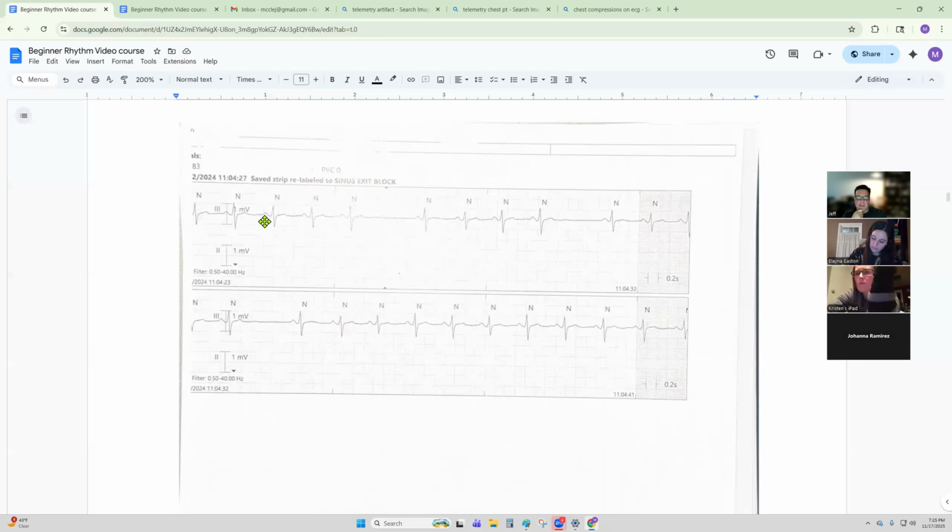So what's happening is, if I had calipers I could use on the screen, you would see if I took 3 P waves, this would march out. And what that means is the SA node is contracting regularly at 83 beats per minute, and a P wave should be there. The SA node knows it contracted at that moment. Beyond that, its job's done. It could care less what happens. It's still going to beat again exactly on time. So with sinus exit blocks, you'll have this very regular interval of dropping.